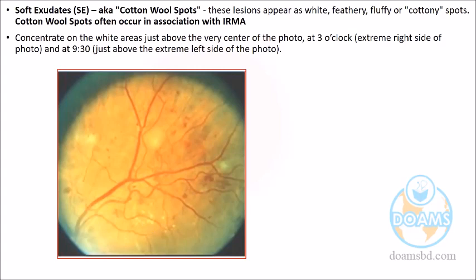It might be exudative. Exudative means hard exudate. Hard exudate maybe. The difference you can observe by your eyes: it has a little clearer outline, while this one has a diffuse outline. You cannot tell what the boundary is. So these are cotton wool spots. This is exudate. Typically these are exudates, but these are not exudates.